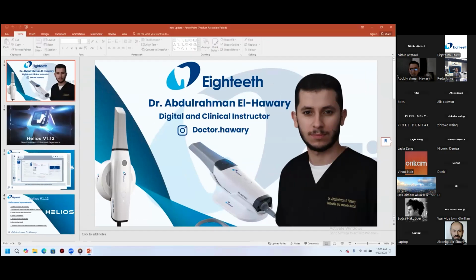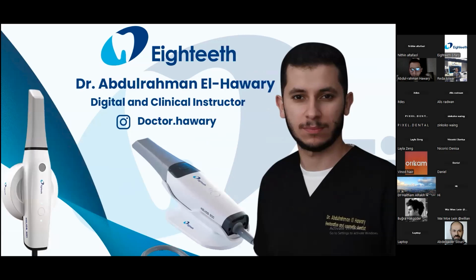So this session will be mainly for the newly released update for the Helios intraoral scanners, the whole series, both the 680 and Helios 500. This will be a software introduction and a software walkthrough.